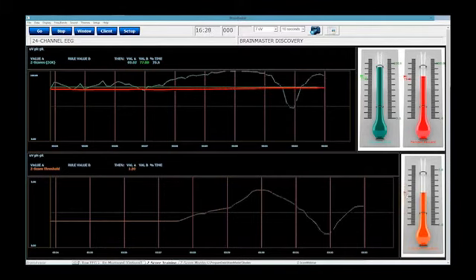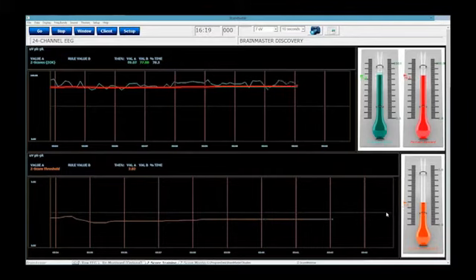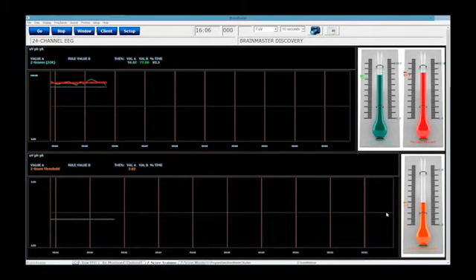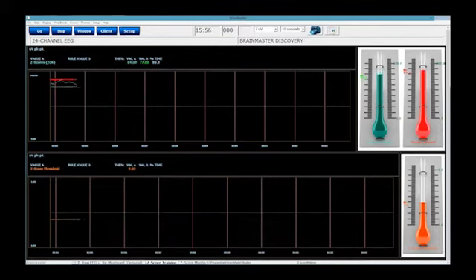So I don't even have to use the hotkeys should I not want to. I can use the drag and drop feature right here. The biggest thing about PZOK that's nice is one threshold. The downfall is that your upper standard deviation and your lower standard deviation are both the same, so you have no control over the difference between them. So that is a PZOK training right there.